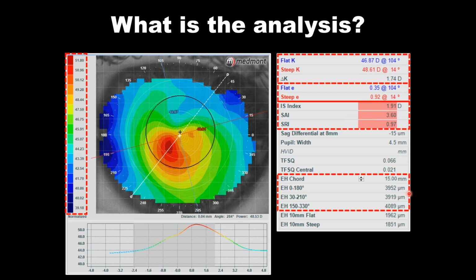So that's a really good indication that we have a much higher depth than the normal eye. And then if we look at the corneal height alone, so this is estimating the anterior chamber, and this lower analysis is really only looking at 10 millimeters. And we see that the corneal sagittal depth is about 1,850 to about 1,960. So that's around 100 to 200 microns higher than the norm. So again, a lot of the indicators, basically all of them, are indicating that this is an irregular eye.